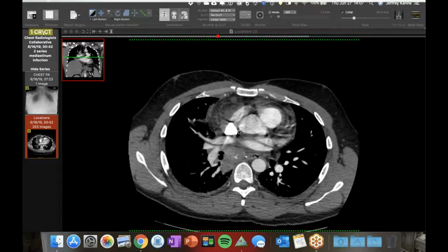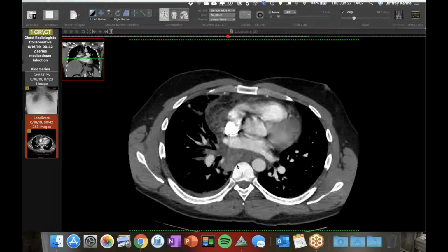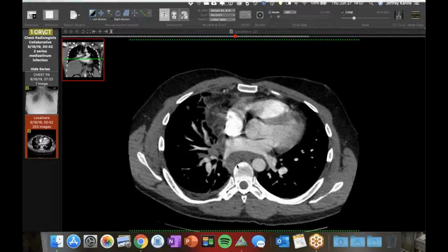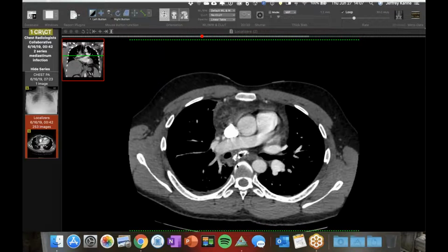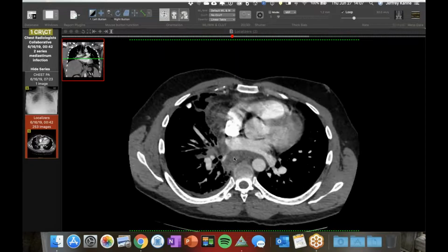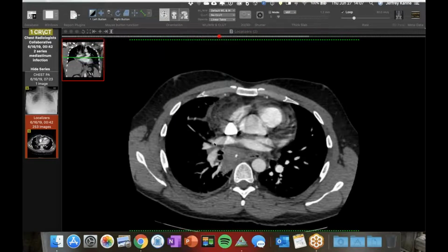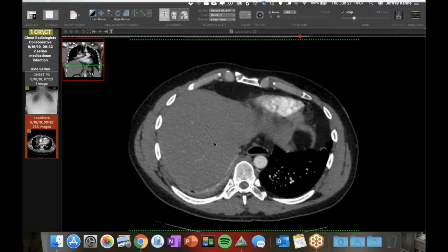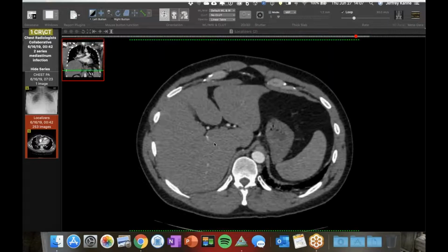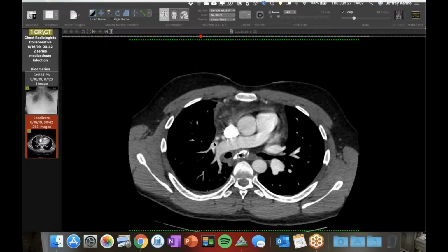I don't think I've seen an acute mediastinitis that didn't come from either above, an esophageal issue, or seeded from below. Jeff, what is that white stuff near the esophagus? It is calcium in a lymph node that looks like old histo, and he has findings of old histo. He's got a dominant nodule in his middle lobe and some draining lymph nodes in that vicinity. So that's what we think it is. It's just a super infected lymph node. Nothing in the spleen. Not reactivation of histo or anything like that.